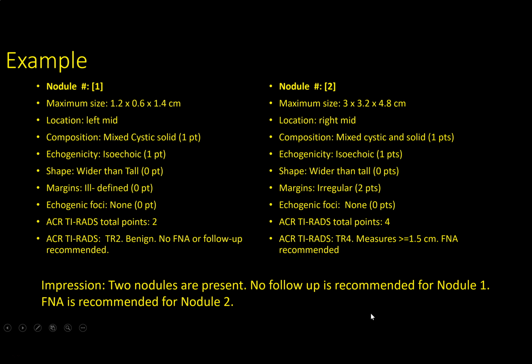Then finally, for my summary, 2 nodules are present. No follow-up is recommended for nodule 1. FNA is recommended for nodule 2. I personally think it's very important to have a summary showing all your nodules and really drawing attention to the management for them. The description can occur in the body of the report, as it always should. The management should definitely occur in the impression. So if there's no follow-up necessary, that's great. And if there's FNA, I would definitely bring attention to that.